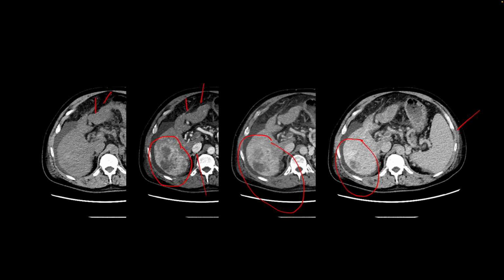In this patient, we were trying to evaluate for any evidence of HCC in a cirrhotic patient. They also have small volume ascites. So we would give this an LR-M for malignancy. It turned out to be a cholangiocarcinoma.